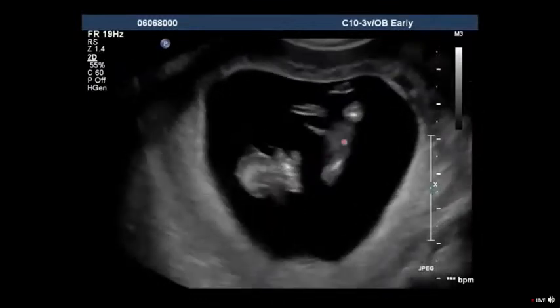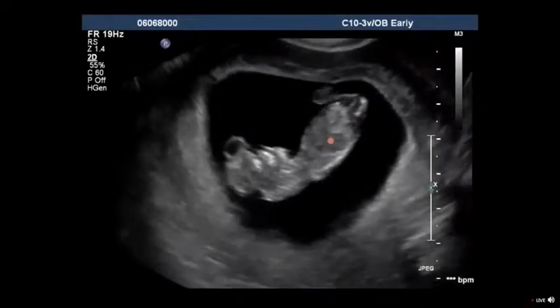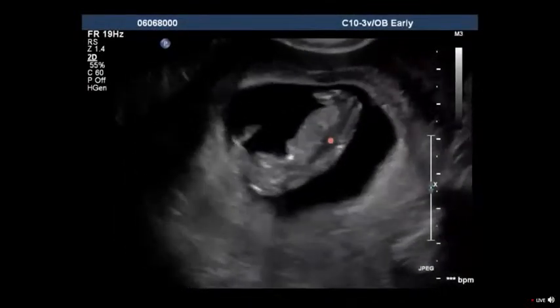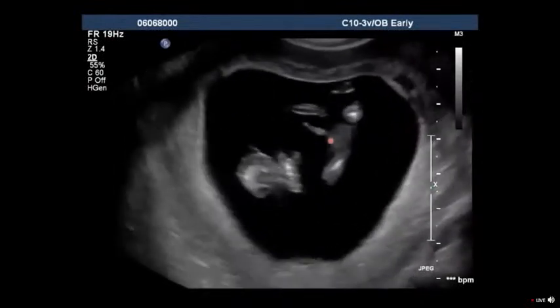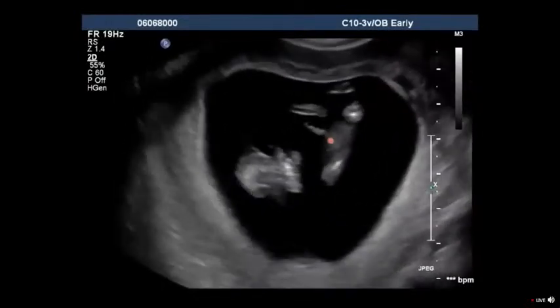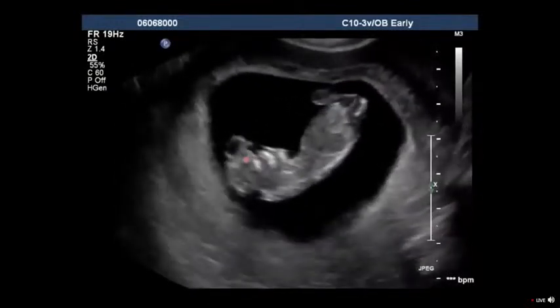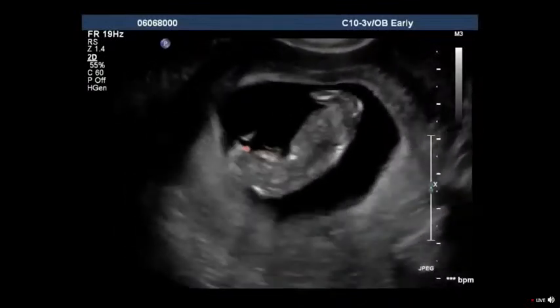This doesn't look normal, right? We got the bottom of the baby, but no top of the skull. No top of the skull. Any diagnosis you would give to that description of anatomy? The brain's supposed to be in the skull, right? Anencephaly, but the brain is. It's like anencephaly.